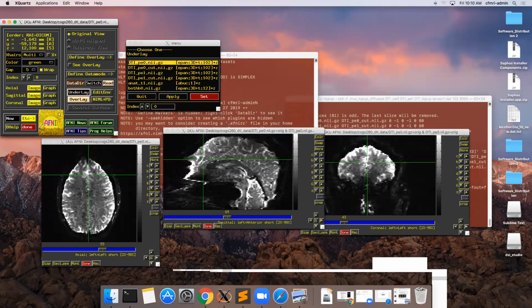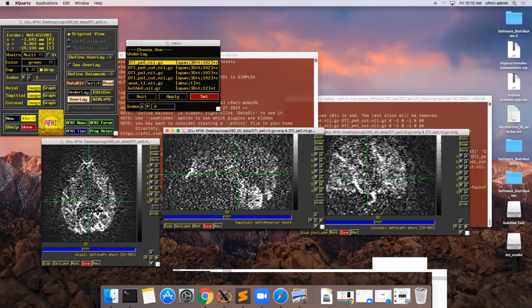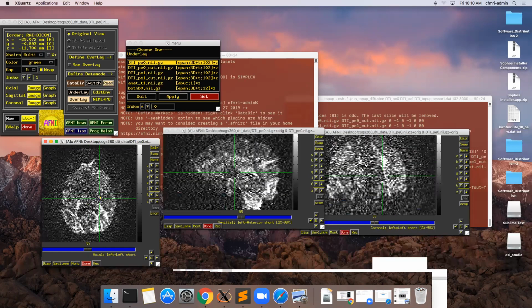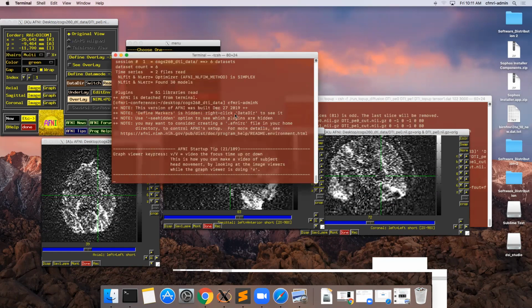If you look through the volumes, then you're actually looking at not time exactly, but you're looking at the different diffusion directions that it's collecting. And as you go through, I don't know if you guys have done that, you'll notice images can look very, very noisy. In this case, this is actually really noisy, depending on the B value. So the higher the B value, the noisier the data set will look. And as we go through, you'll notice this is a multi-shell protocol, so we have several different B values. We have 3,000. Actually, I'll pull it up here so we know for sure.